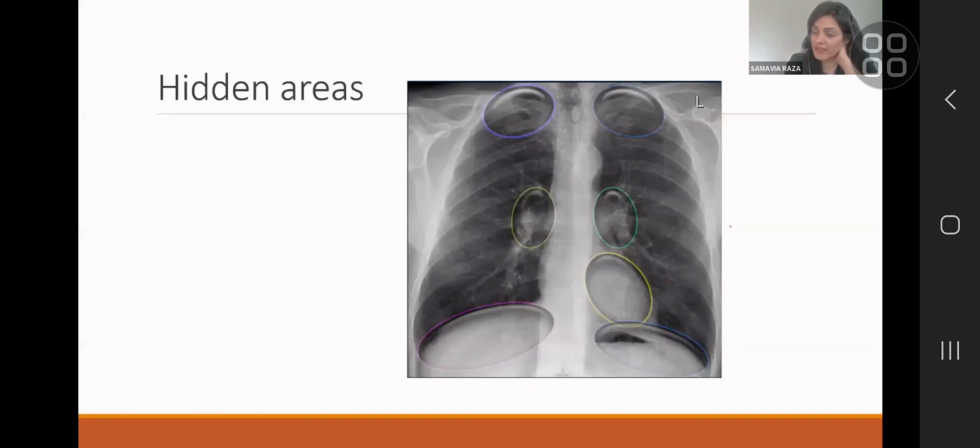The only silhouette sign that will be very clear is when something is sitting on the diaphragm. And if you see something sitting on the diaphragm on a lateral view, you most definitely will see it on the frontal view. So nobody does the lateral view to delineate the diaphragm anymore, at least. To identify pathology or function of the diaphragm, what was used to be and still is in most places is the ultrasound for diaphragm motion. Some places do MRI diaphragm to see it moving. If you want to see the cause of the diaphragm malfunction, you do CT.